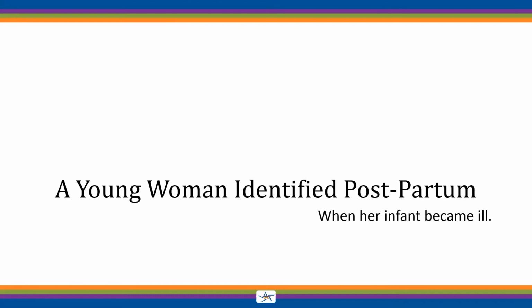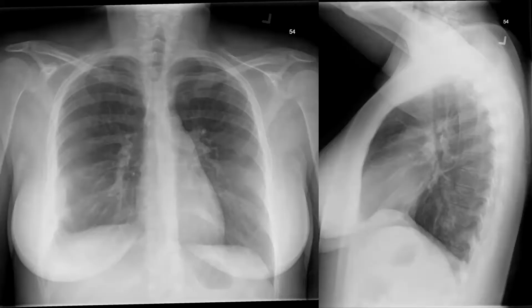She had a chest x-ray. And this is her chest x-ray. Let me see. I'm not sure if this projects very well. Chelsea, can you see my mouse? Yeah, we can see it.